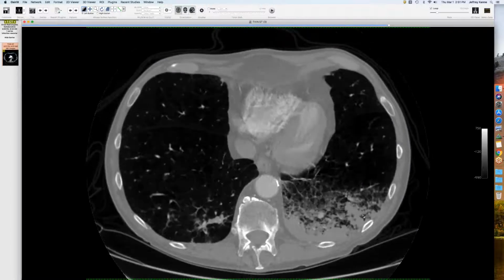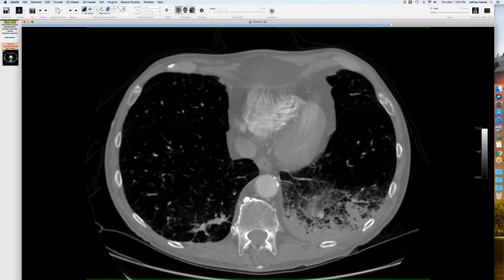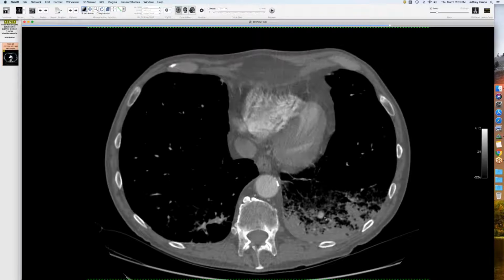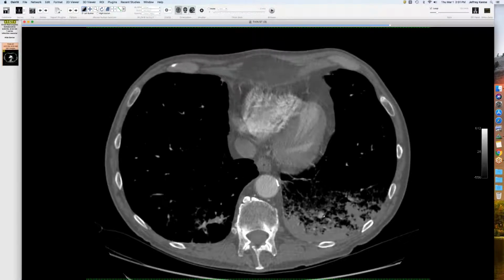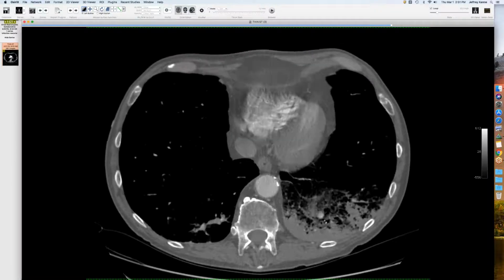And the reason he has hemoptysis is all the way right, this little guy right here. I can't think if this is our study, but we got an outside one as well that showed this little bitty area right here, sitting right above the diaphragm. So it's presumably a little pseudoaneurysm, and you can follow it back to these little branch pulmonary arteries. I'm presuming that's what it's coming from.